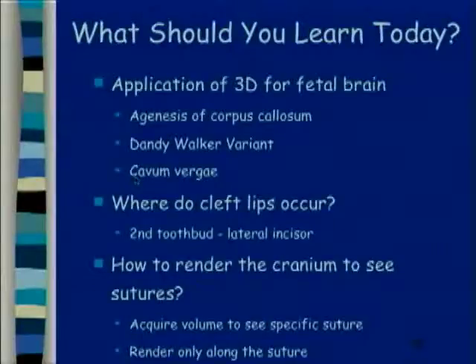Where do cleft lips occur? Look at that second lateral tooth bud. At that lateral incisor, that's where you're going to identify your clefts. So whether you're looking at 2D or 3D, that's the position to look.